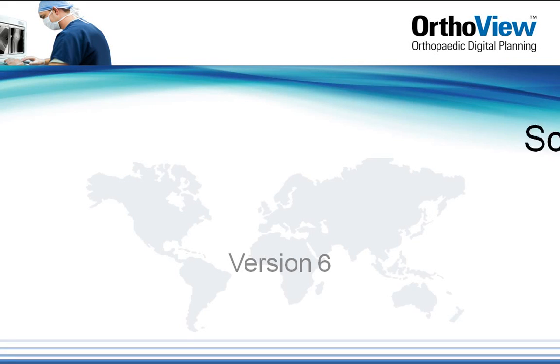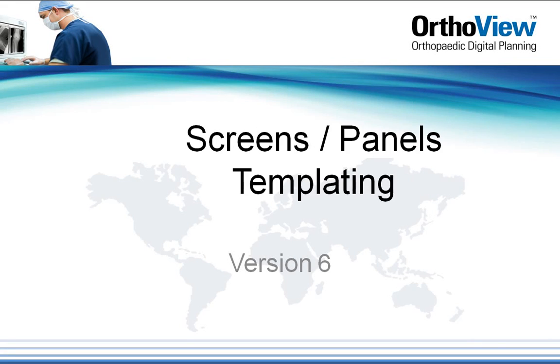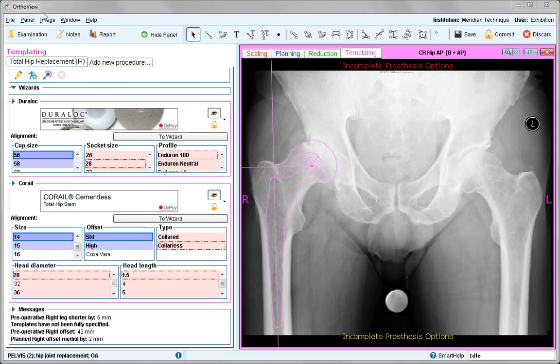In this video tutorial, we review the templating panel. Once you move to templating, and if auto recommended has been selected under the file preferences menu, the sizes recommended in these blue bands will automatically appear on the screen.